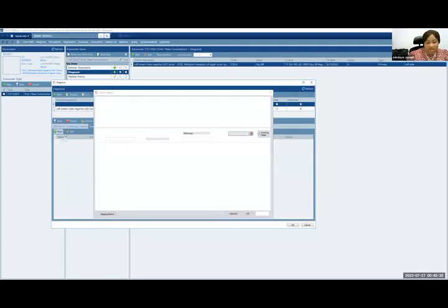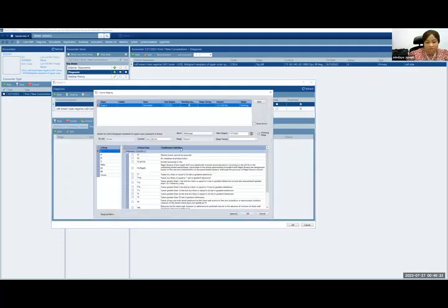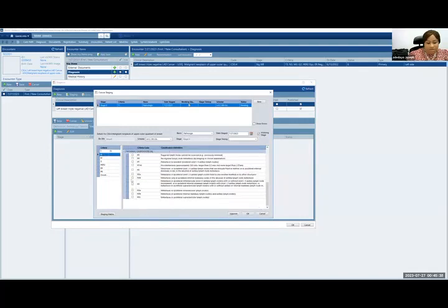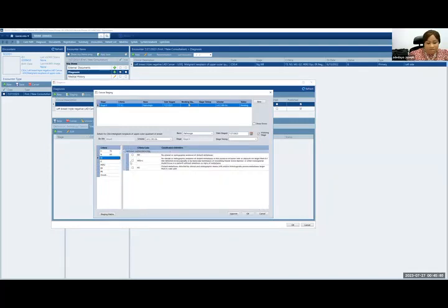And then we'll fill in all the pathology and we can come in here and fill in the stage. So I'm just going to skip through this very quickly because I want to get to the point. So she's a T3, N3. She's now an M1, still a grade 2. HER2 is now negative, ER is negative, PR is negative, oncotype score is not evaluated.